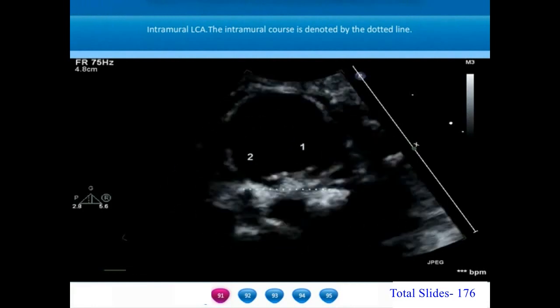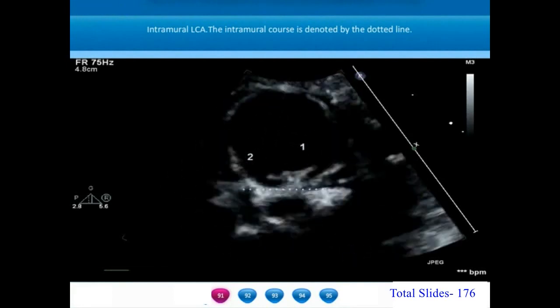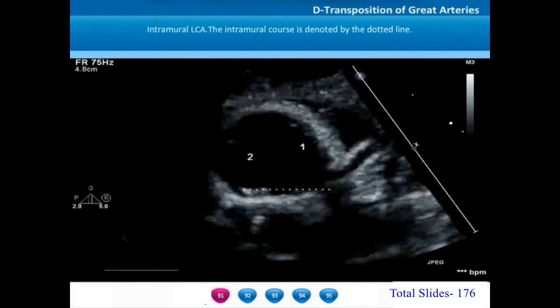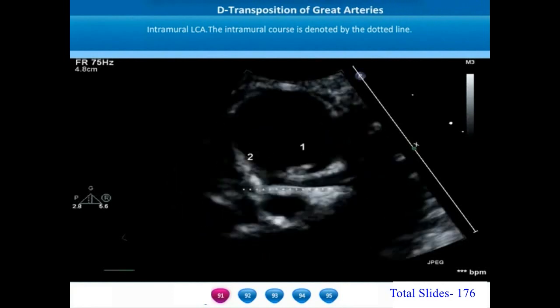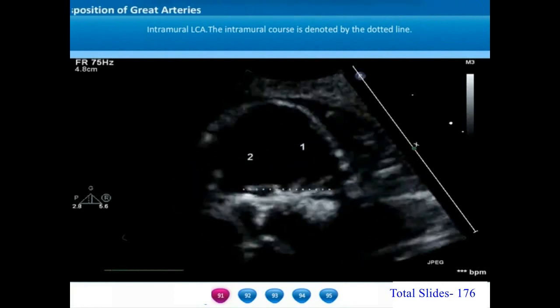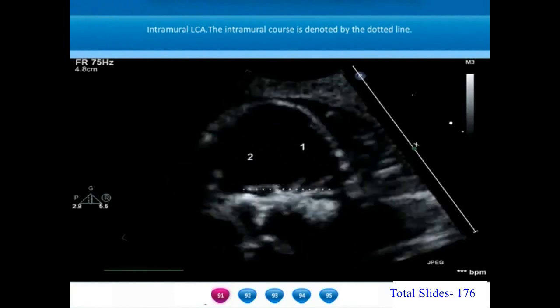The second echocardiographic feature is course between the aorta and PA. Number 3, the wall of the coronary artery will be shared with the wall of the aorta, giving a railroad appearance of the coronary artery between the aortic and the pulmonary sinuses.